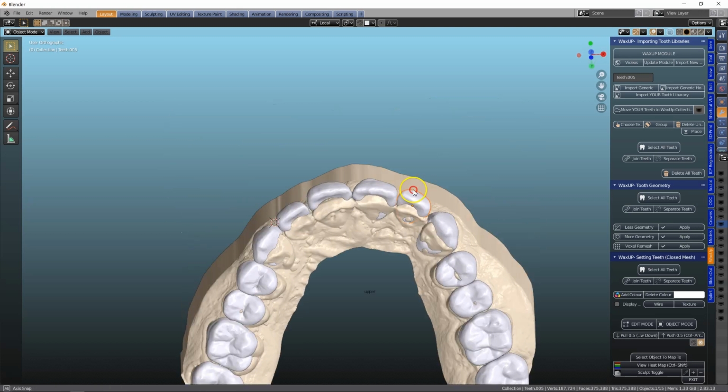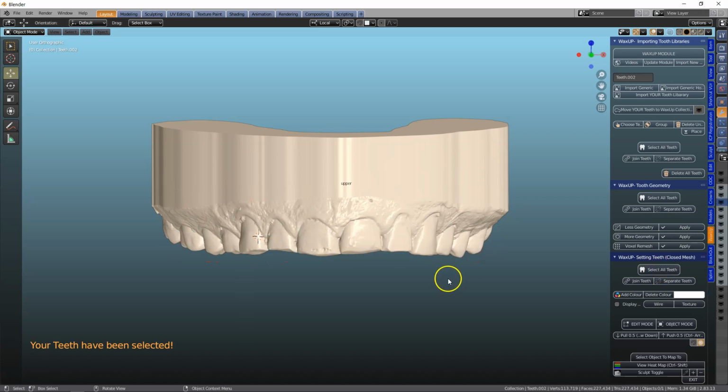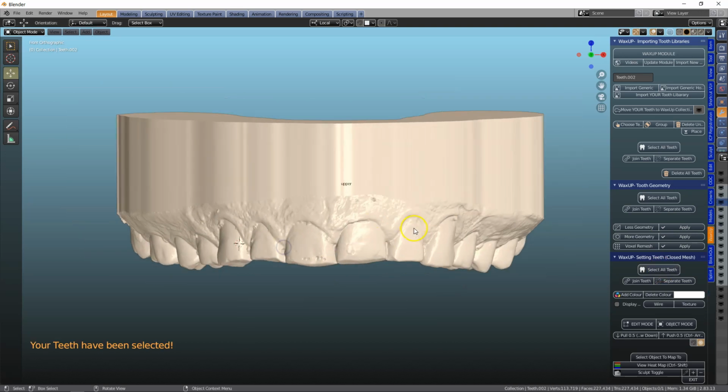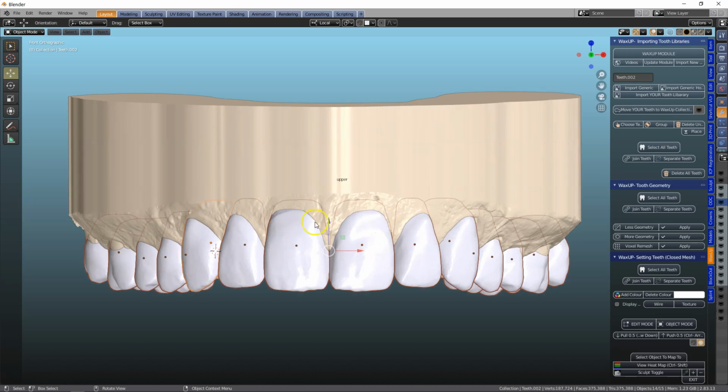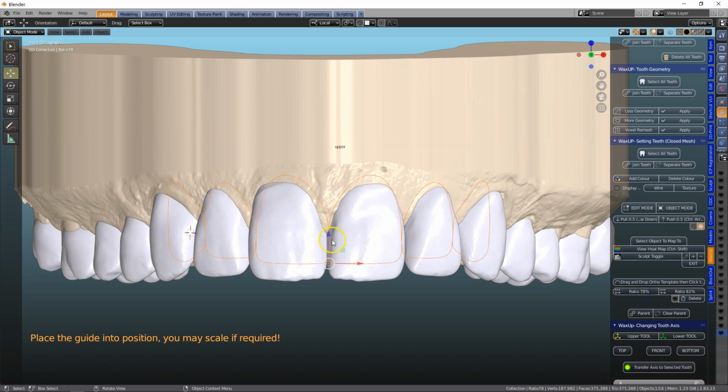Here's one way of doing a gingivectomy guide. You can do this with the Splint or the guide module. So the first thing we're going to do is make a wax up. And with this wax up, we want to make sure that we've got the correct ratio.